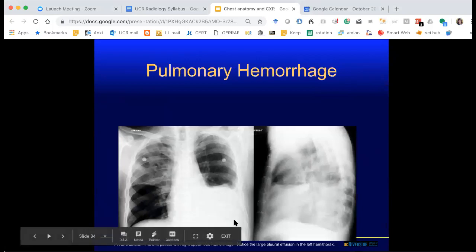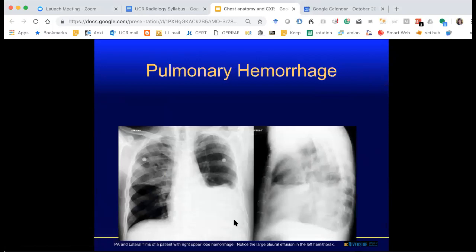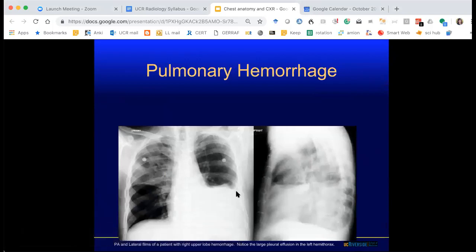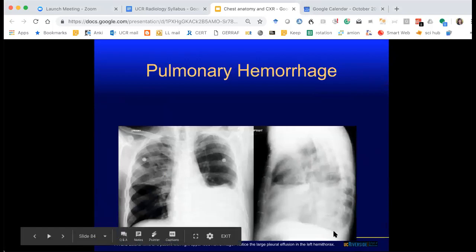What do you think about the lungs and the pleura? The left side is less. Less what? Less volume? Less bulging of the left angle. Here? Blunting. Oh, sorry, yes, there's blunting. So the left side is blunted. Yeah, so you have an effusion.